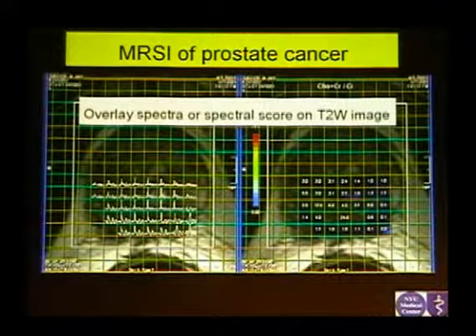And spectroscopy was really helpful in this case because you see extensive choline peaks all over the place, meaning that there is active replication, active multiplication of cancer in this case, and this was active, diffuse cancer, basically. So we'd like to go back to choline. Choline is thought to represent cellular multiplication.